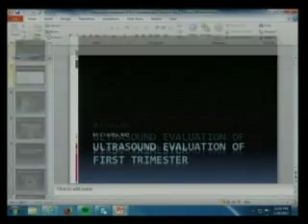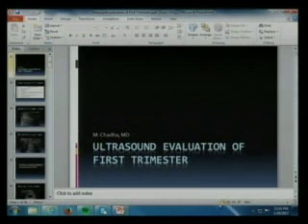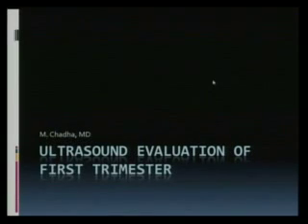All right, let's start with this. It's a very objective analysis. I am trying to limit the amount of text. This is an ultrasound lecture that I have made. Images are going to be doing the talking. I'm going to be doing some of the talking. There's hardly any text in here. And this is purely for on-call help and a good thing to refer to as a guide.